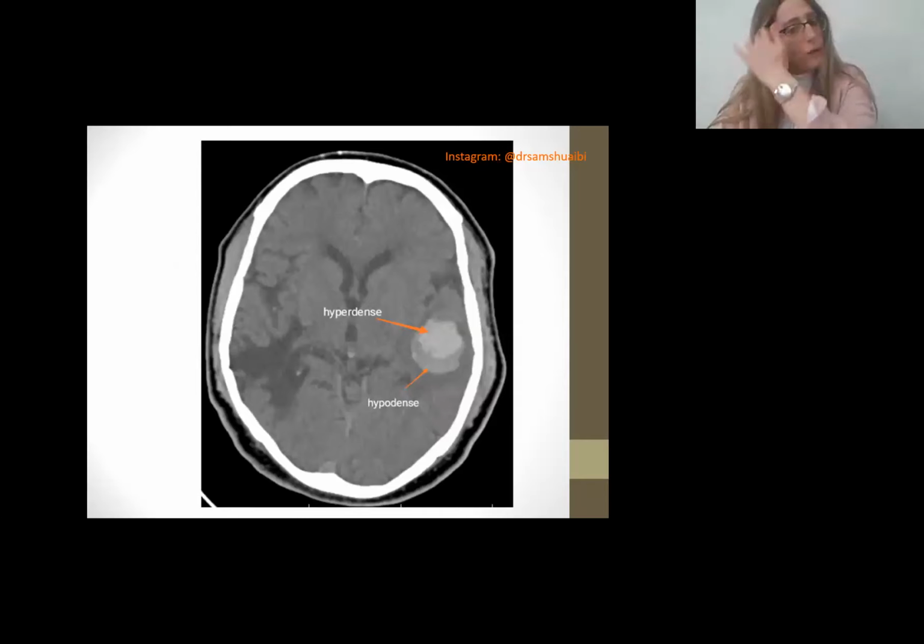This is another example. That's what I'm saying. I just want you to familiarize, because CT images is you going over and over and over. This is like a crash course, okay, guys? So it's you going over and over and over these CTs in order to basically get your eyes accustomed to it.